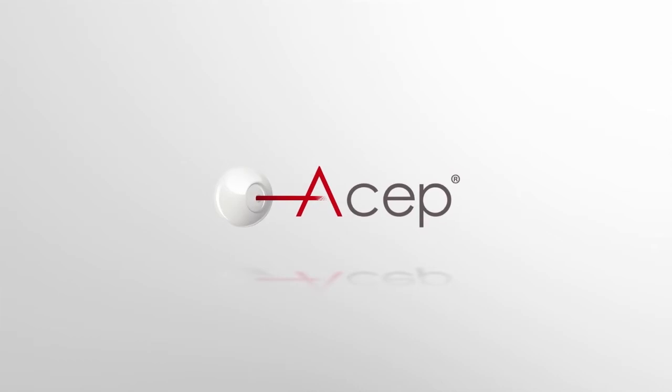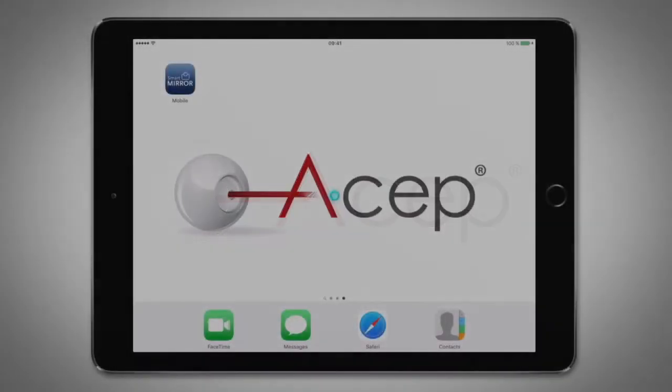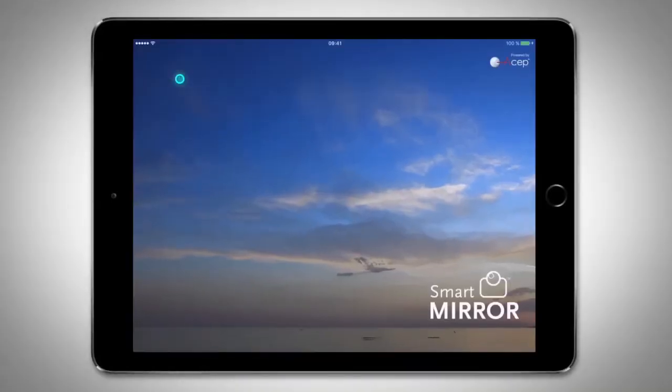Smart Mirror is your optical dispensary's new indispensable tool that enhances the eyewear selling process. Get ready to dazzle your customers. Smart Mirror is composed of 3 core modules.